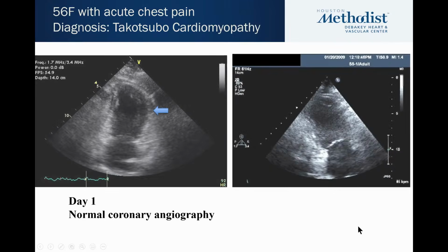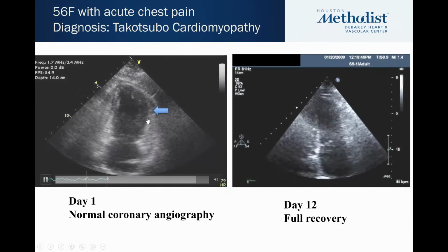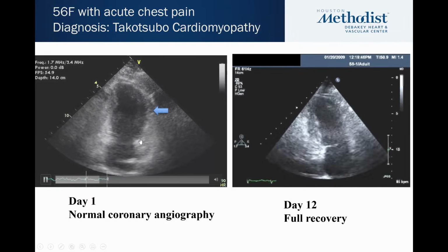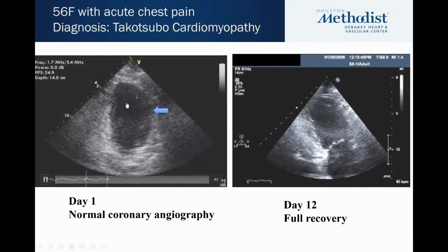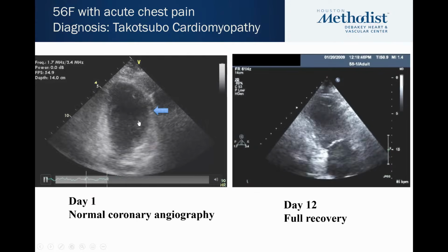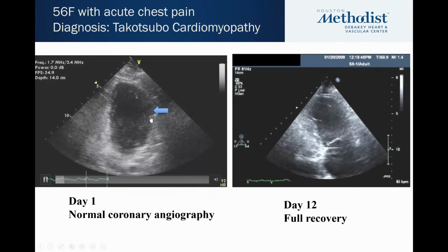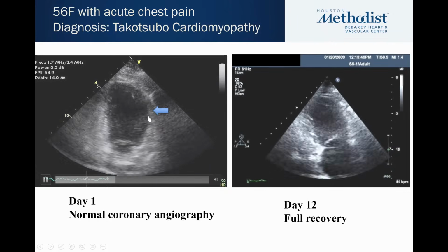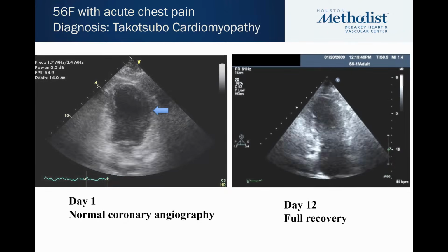Now, you may have non-apical involvement. This is one that has that middle segment. This would look more like a diagonal type of infarct because the base is contracting great and the apex is fine, so one would think of a diagonal or an obtuse marginal causing this, but it's not. Coronaries were clean. So this is a more atypical variant of Takotsubo.